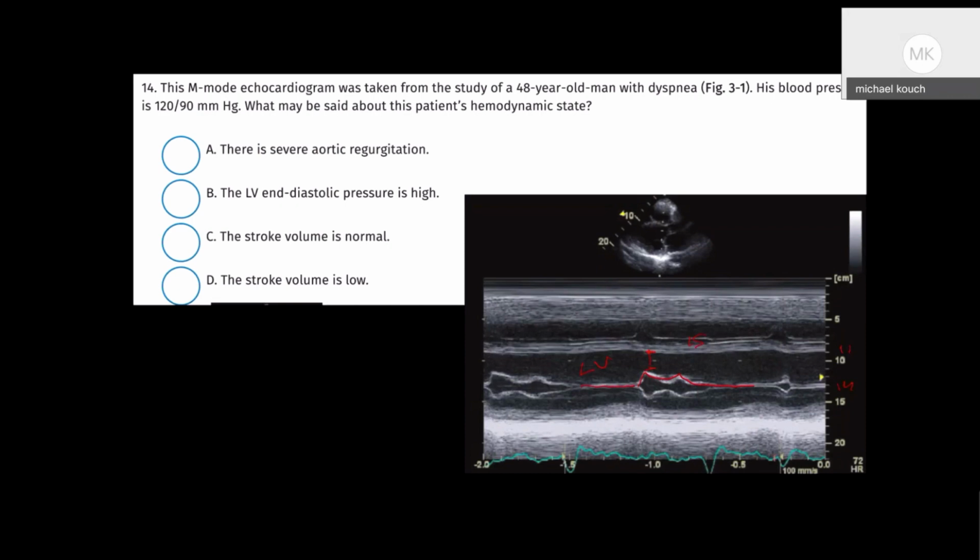Potentially dilated cardiomyopathy, right? Except in the setting of mitral stenosis or aortic regurgitation. Good, perfect. So no aortic, no mitral stenosis, and no aortic regurg, and so we think that there's dilated cardiomyopathy. So let's go through these. There's aortic regurg. Is there any evidence of that here? We don't really have fluttering of this E wave. Everything looks normal, and these waveforms are not present.